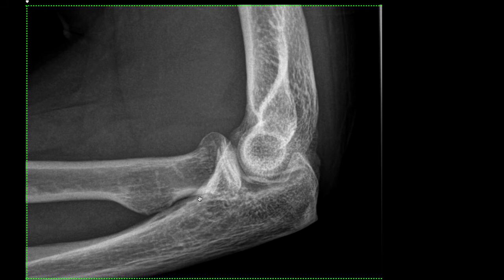Yes, there is a fracture here. Look at that. When you follow the cortex line here, you can see a small radiolucent line coming across here. It's so damn subtle. And you're a boss, you diagnose a fracture. Personally, I didn't, so I was a bit ashamed after this, but who cares? That's life. Let's move on.